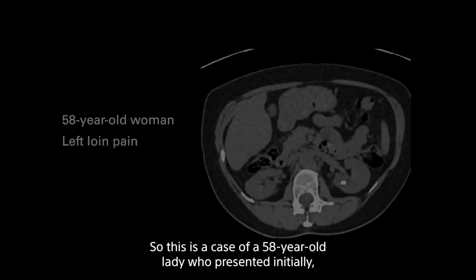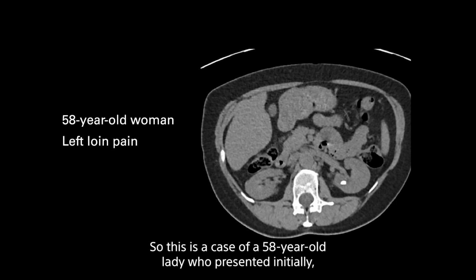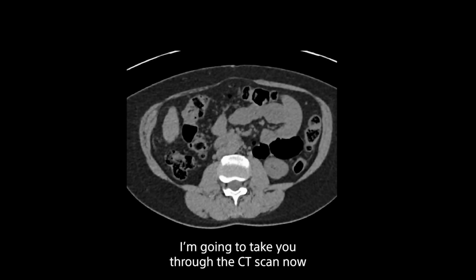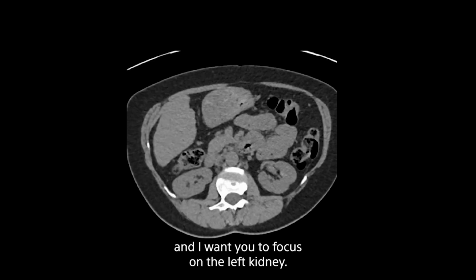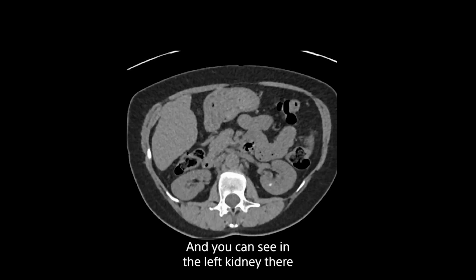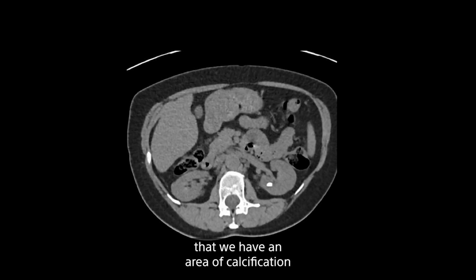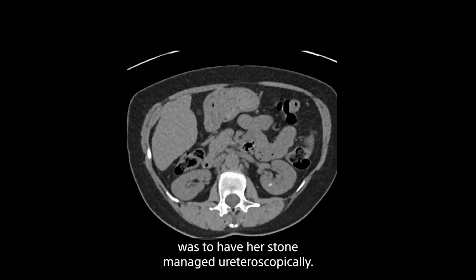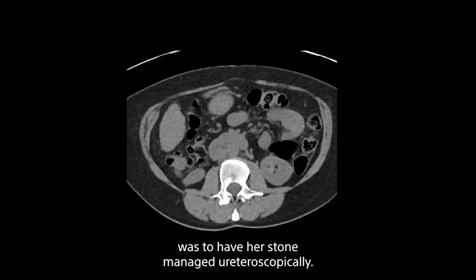offer patients. So this is a case of a 58-year-old lady who presented initially to colleagues with left-sided loin pain. I'm going to take you through the CT scan now, and I want you to focus on the left kidney. And you can see in the left kidney there that we have an area of calcification just medially and in the interpolar area, which looks like some stone. So the plan for this lady was to have that stone managed ureteroscopically.